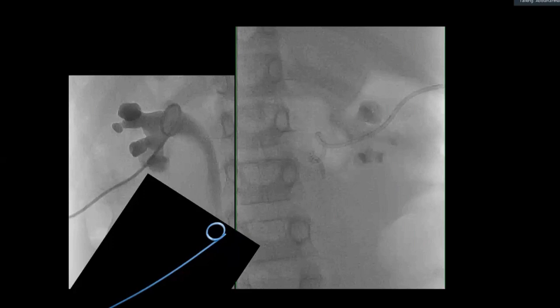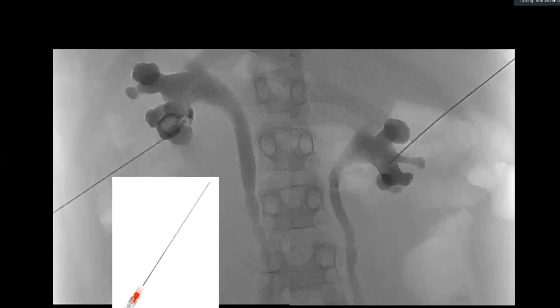What is the age of this patient? Roughly. My age or somebody's children's age? So some young patient, pediatric age group. Okay, excellent. Okay, excellent. So well done.